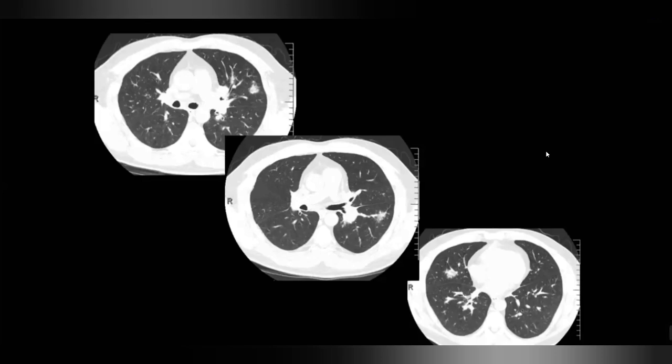Next, I would like to see the contrast enhanced CT. Remember the clinical scenario. This patient had HIV with bloody sputum, okay? So all what you said is correct, but when you establish your differential diagnosis, it's almost always good to keep in mind the clinical scenario. Even if tuberculosis is more common in the AIDS patient, is this the classical appearance of tuberculosis? No. It looks more like neoplastic.